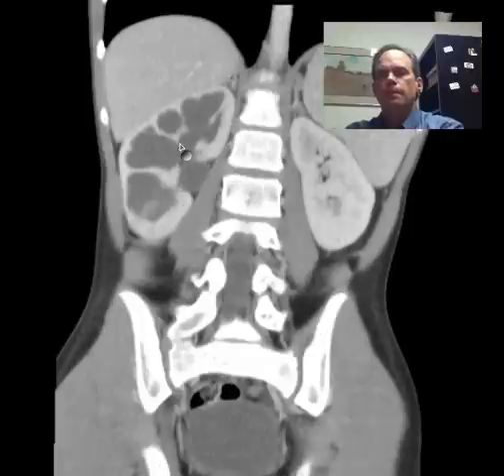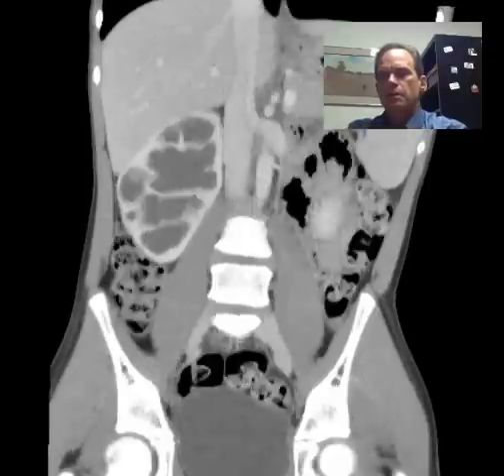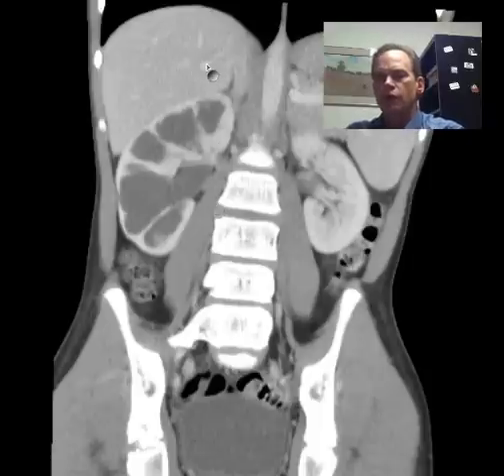Hard to tell. Now that could be analyzed with radionuclide nuclear medicine imaging. That could be contributory there. But this is important to realize that this is not acute. So these are the findings in a chronic UPJ, a chronic ureteropelvic junction obstruction.